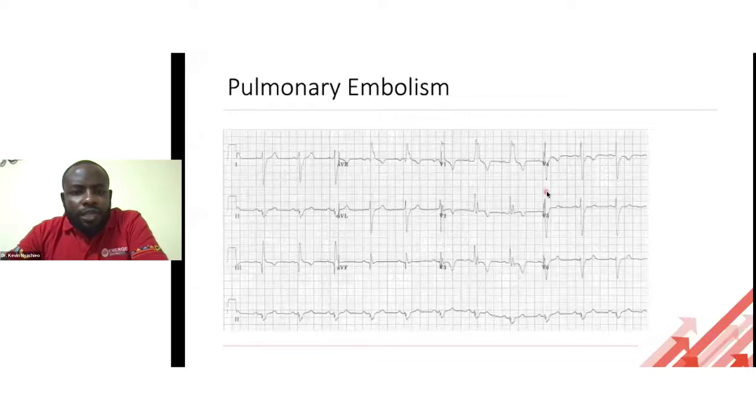This already should be telling you that these are features of right heart strain. You should not delay this patient's management in confirming the diagnosis of pulmonary embolism before starting your low molecular weight heparin. Pulmonary embolism, what I want to get across, sinus tachy is the commonest feature.